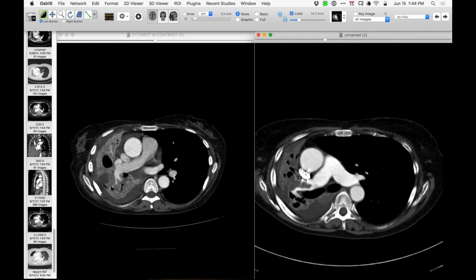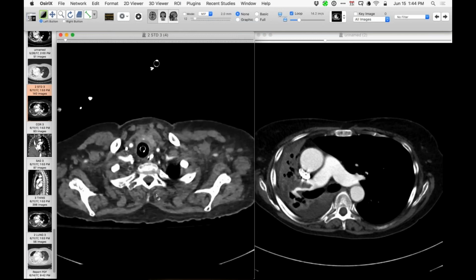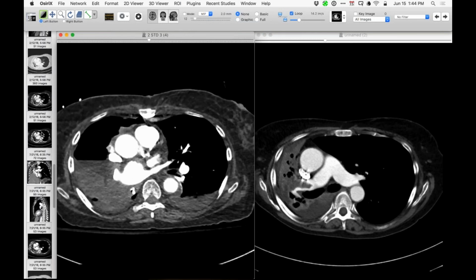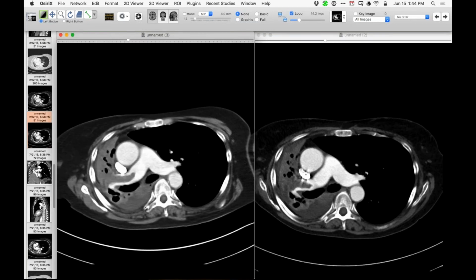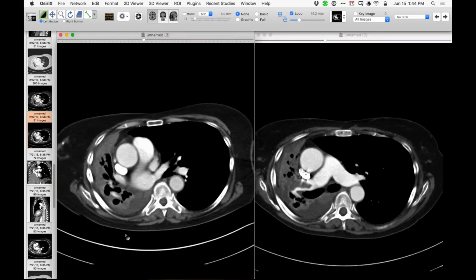And I think it got a bit bigger. So let me go to June of this year, and let's look at the size of that. No, that's post-op. So let's go to February. There you see it there. So I think the most likely explanation is just in situ thrombosis and progression of it in the context of slow flow.